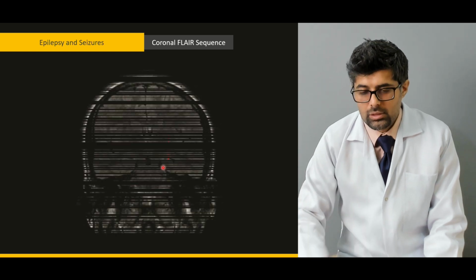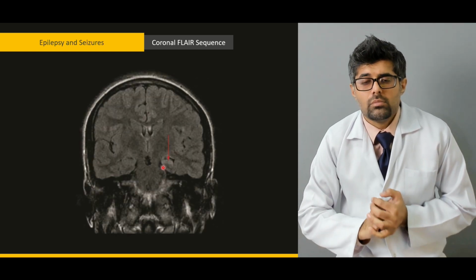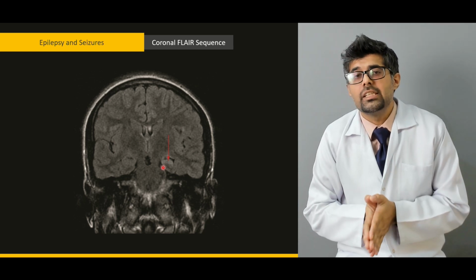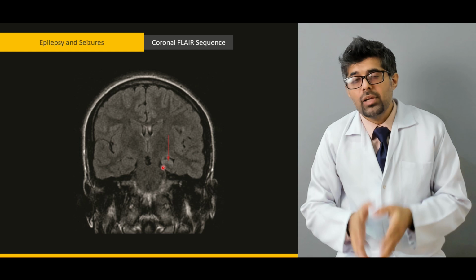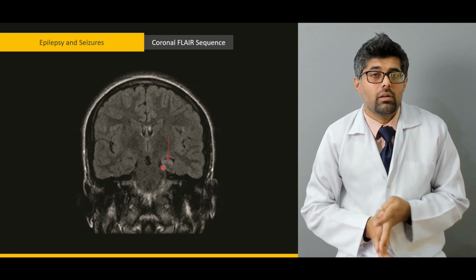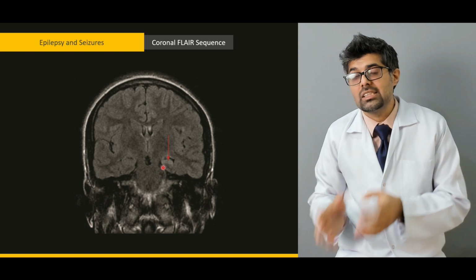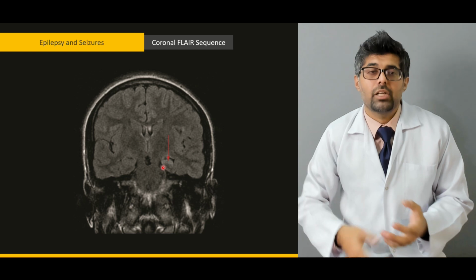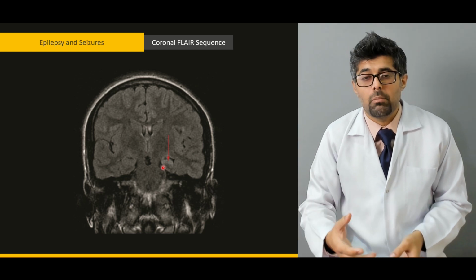Our next one is a coronal FLAIR sequence. Now, FLAIR is again a sequence of MRI. It is not a separate modality. It is a sequence that we perform during the MRI.